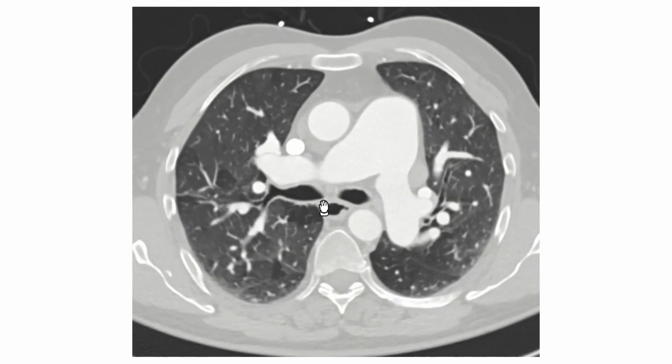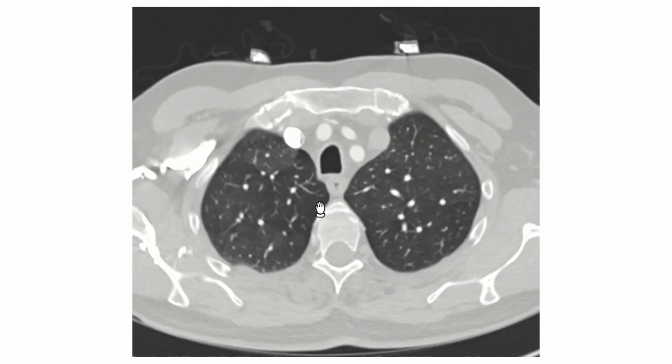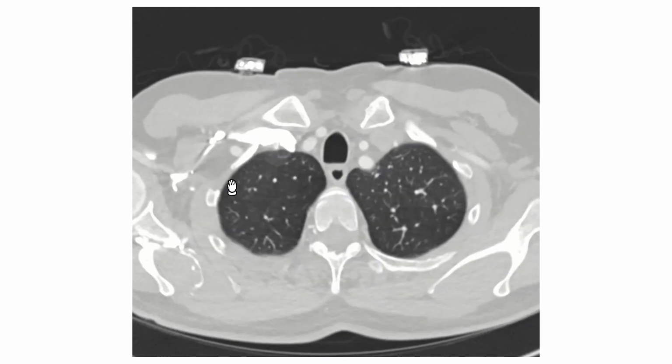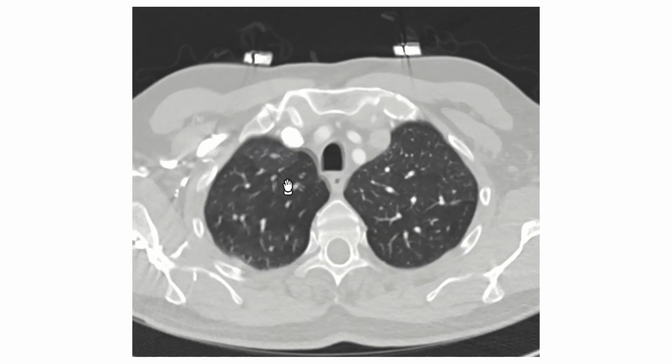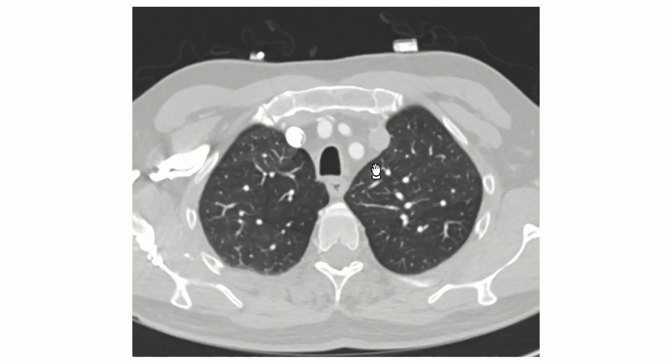However, if we scroll carefully through the anatomy on the axial images, from cranial to caudal, we will see that the contrast is injected from the right side. That's why it's very bright on the right side. However, if we follow the segmental anatomy clearly, we could see that there is contrast here in this superior vena cava, and there is this vessel parallel to it on the other side, kind of a mirror image of it.